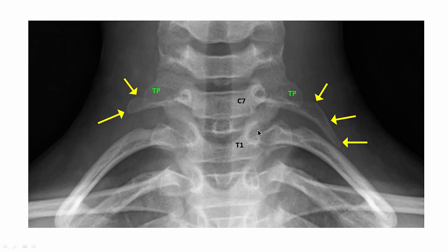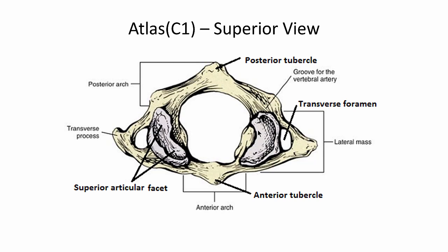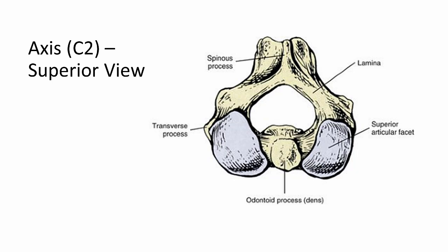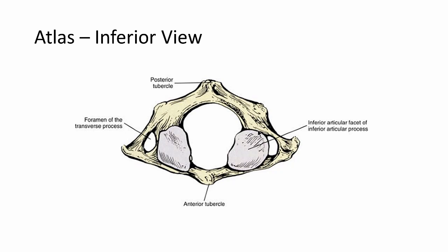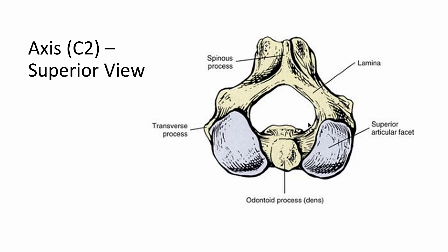Okay, trying to speed through this. I'm not going to go through this. You can go to the other tape to see this. We talked about all this already. Talk about this one. Here's the dens. This is a little confusing. Let's go to the special ones here.